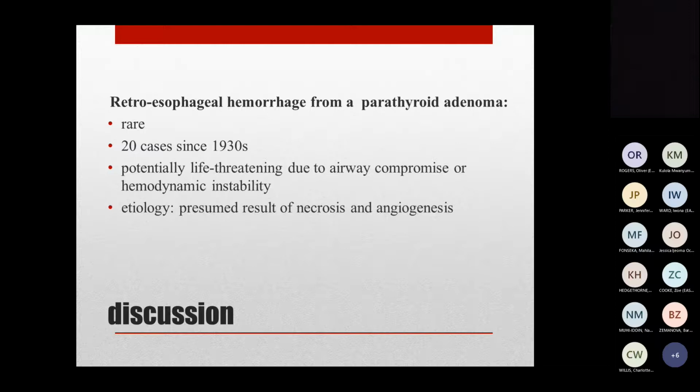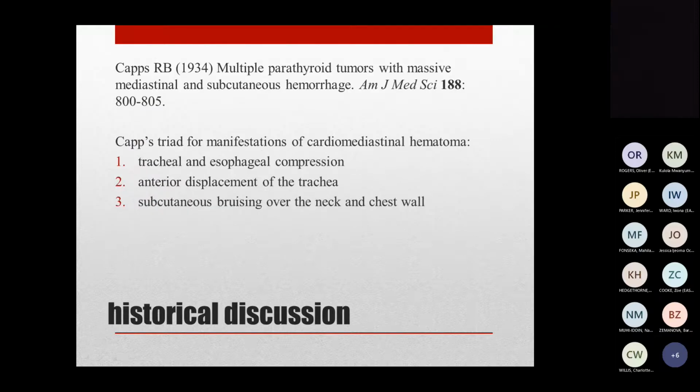Retroesophageal hemorrhage from this diagnosis is quite rare, and there are only 20 cases in the reported literature since 1930. It's a potentially life-threatening condition due to airway compromise or hemodynamic instability. It's presumed the result of necrosis and angiogenesis within the rapidly enlarging parathyroid adenoma.